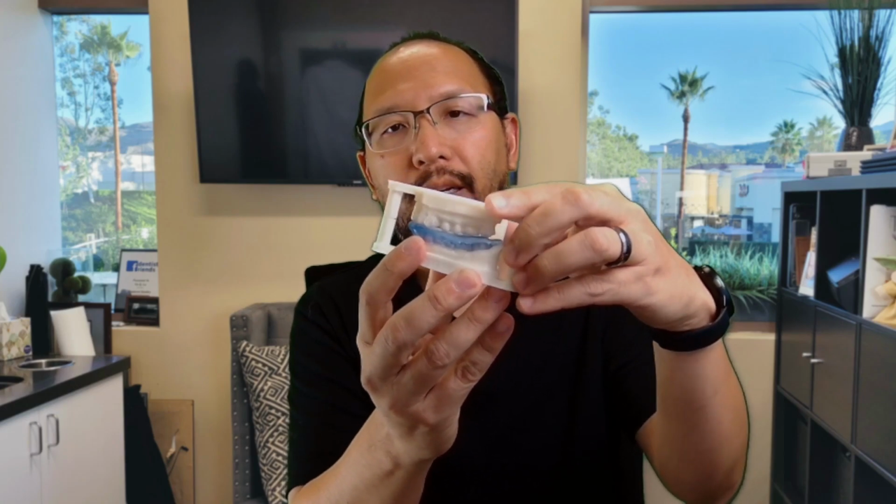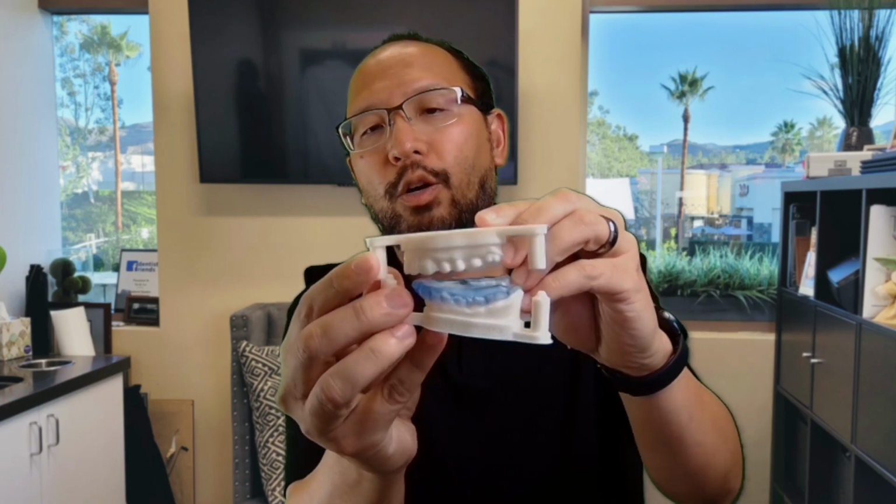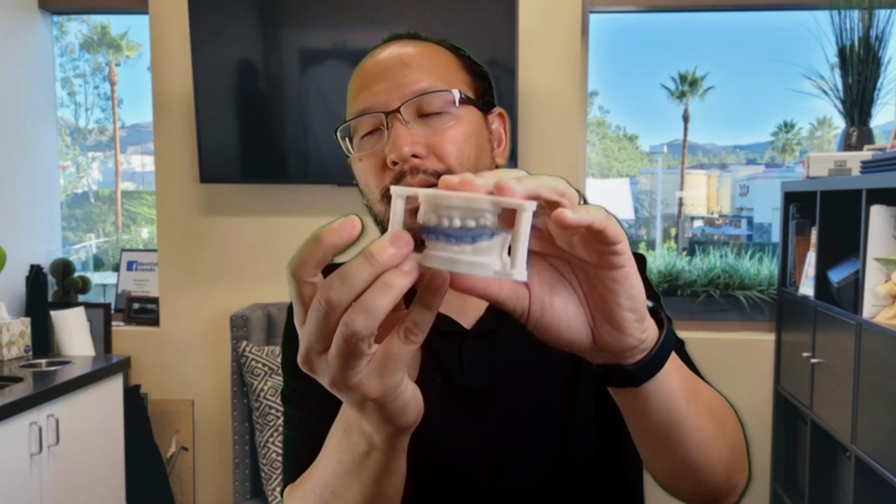It's an articulated model with a night guard in it. When we propose a night guard, this gives them a tangible idea of what they are getting. The important thing is to have these articulated pins because they help to prevent, as you can see there, the upper or the opposing model from going side to side.